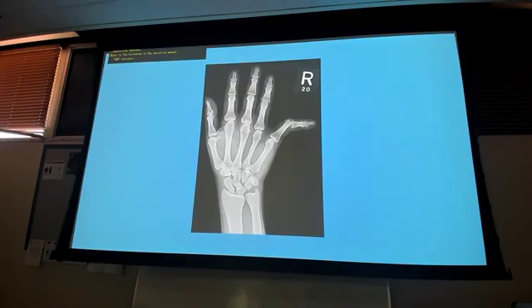No. What do we got here? Subluxation, right, not a dislocation. I have just a little bit of contact right there. Okay? Which way? Ulnar. This is the distal fragment. Good. That's the professionals. Love it.